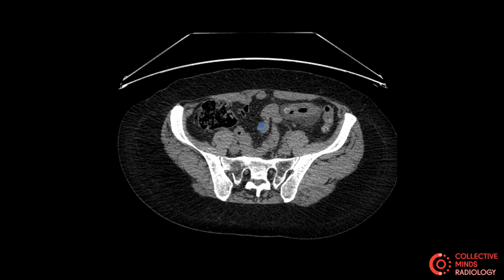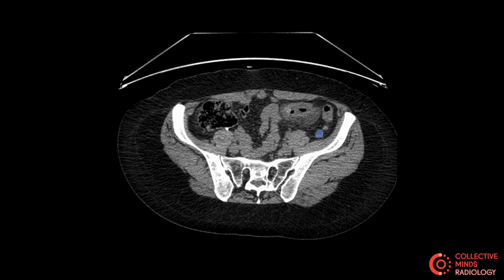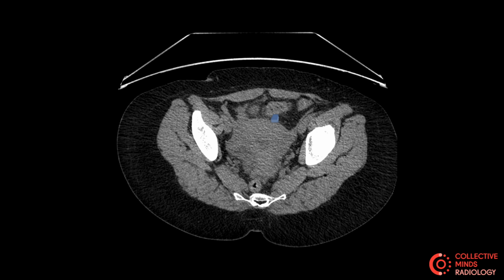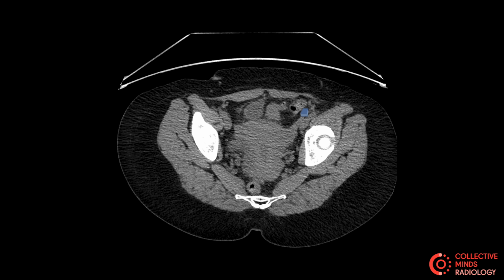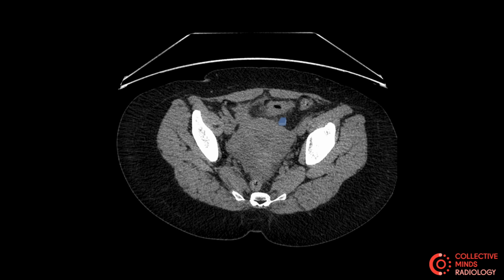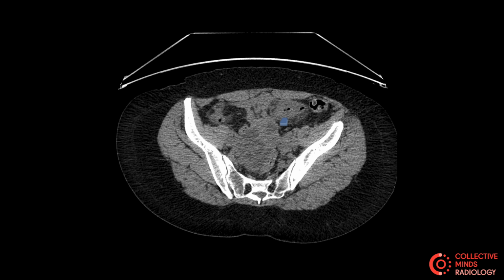It's a bit difficult to follow this bowel, but then you start to see this area of bowel. Remember the fat stranding I was talking about? That is fat, and that is fat as well, but that fat looks very, very cloudy and is located within the left iliac fossa. And as you look at it, you can see that it curves around this way and then back up this way. But this entire segment here has got lots of fat stranding around it. That basically means there's inflammation.